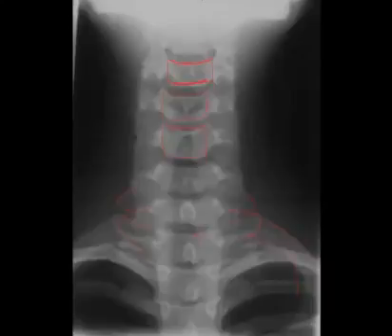Now, we talked about the vertebral bodies. Something else I wanted to touch on were those uncinate processes, because you can see them much better on the AP projection of the cervical spine. These sharp ear-like structures extend off the most lateral aspect of the vertebral body superiorly. These are your uncinate processes, and they actually articulate with the segment above, making that nice uncovertebral joint. Next, intervertebral disc spaces will be between the superior end plate of the lower vertebrae and the inferior end plate of the upper vertebrae, and are perceived as a lucent area.